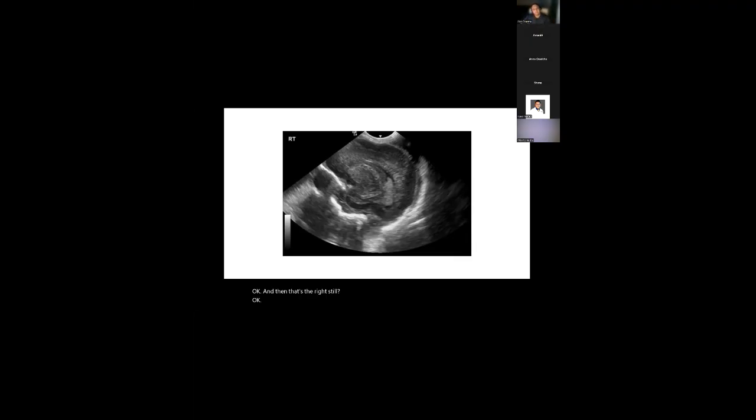When I first saw this, I felt it was normal and just a choroid. But when I reviewed my scan, because I will show you the follow-up scan, I felt maybe there is a bleed here. Is it brighter than this part? It's irregular and quite bulky, so it does raise the possibility that there might be a bleed there.